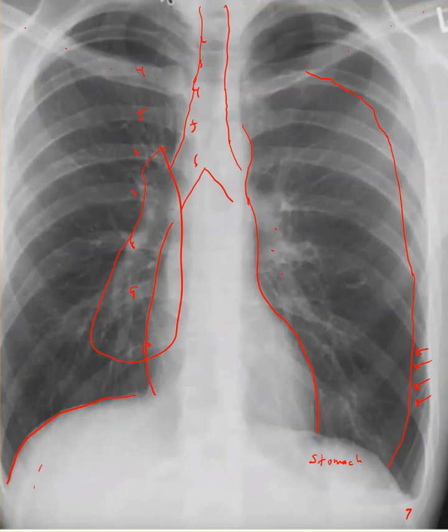So if we were having trouble seeing the pneumothorax, we could get an expiratory view, and I have an expiratory view for this patient, which I'll pop up here in just a second. And it really tends to show the pneumothorax really well. You can also reverse the lighting, and they'll tend to stand out more.